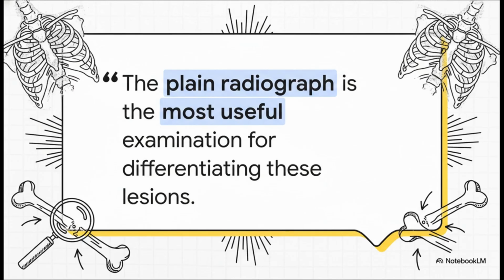And in the end, it all comes back to where we started. In our modern age of unbelievable imaging technology, the simple, elegant, plain X-ray is still the single most important tool in this whole detective story. It's just a testament to the power of careful, fundamental observation.